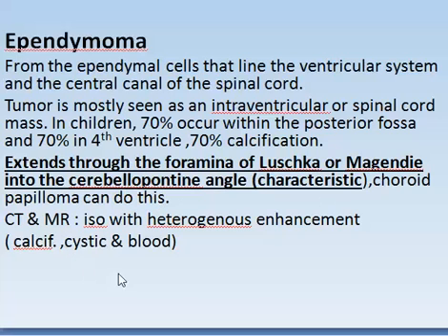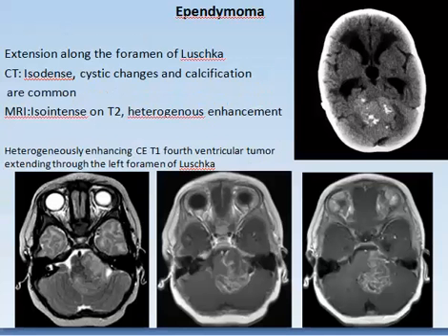On CT and MRI there is iso or heterogeneous enhancement due to calcification, cystic changes, and blood. So this is a tumor on non-contrast CT with calcification.